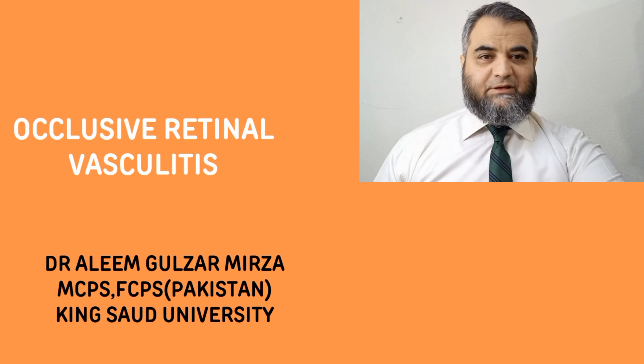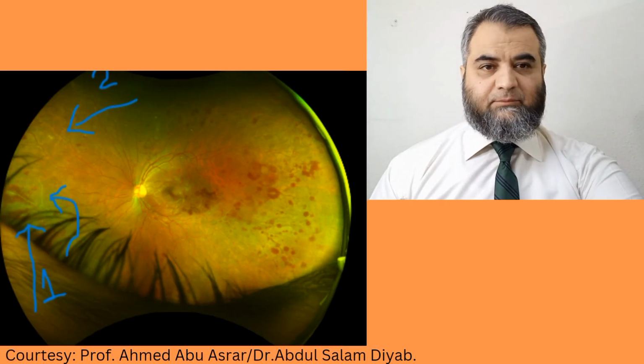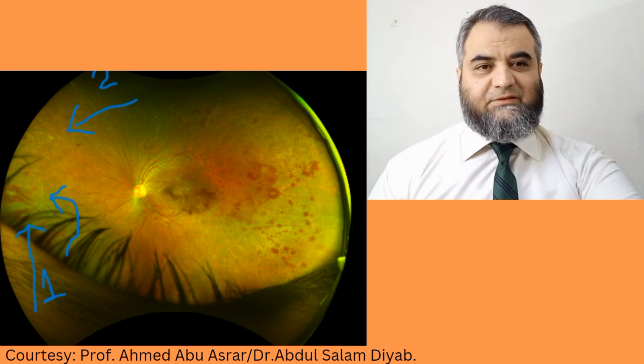Today, the topic of my discussion is occlusive retinal vasculitis. This is a case shared with us by Dr. Abdul Salam Diab, consultant medical retinal uveitis at King Saud University. Let's have a look. So this is the first fundus photograph.